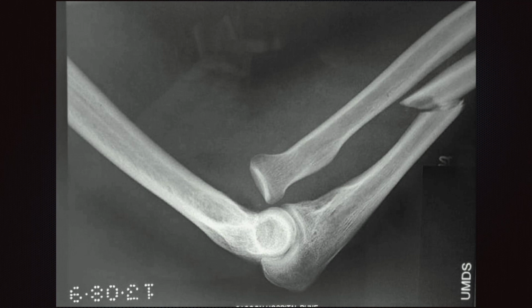The given X-ray shows the elbow joint in lateral position with good centralization, neutral rotation, and adequate exposure. I can see that the joint is showing the bones of a skeletally mature individual. The humero-ulnar articulation appears to be well maintained.